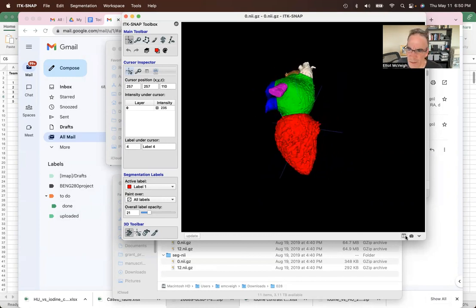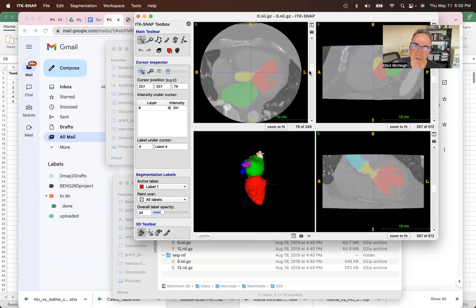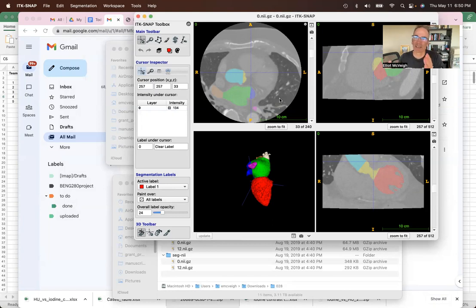So let's go back to the view where I have the images here. The opacity can go high or low, and you can see how those segmentations fit on top of the original images. Obviously, what you guys are going to want to do is train on this as the ground truth, with the associated image as the input. Save half of those, or I don't know, 25% of them off to the side, and then test your network on the ones that you've saved off to the side.